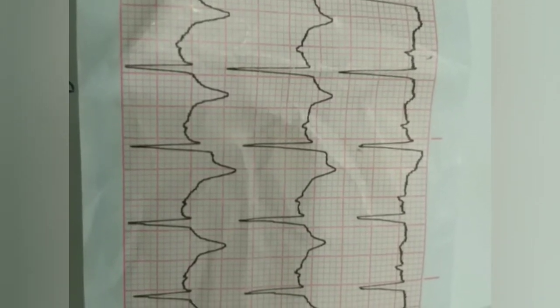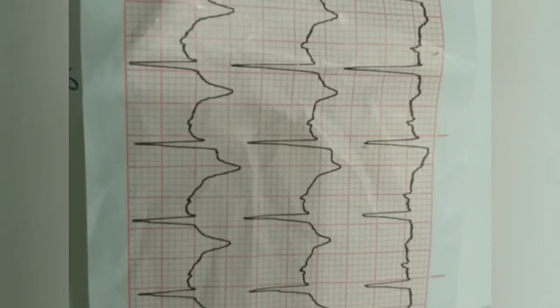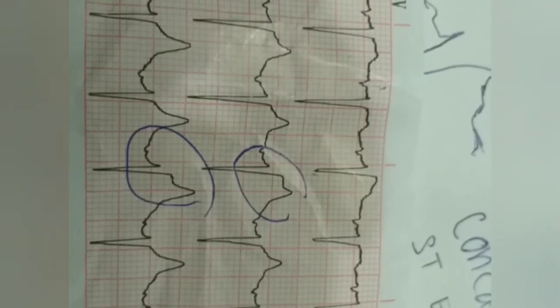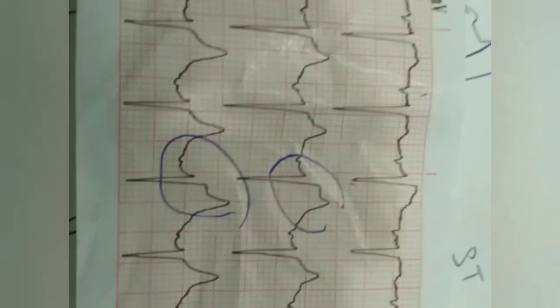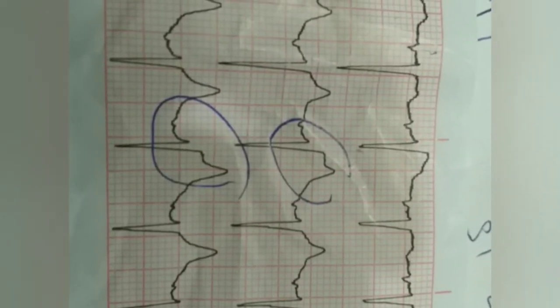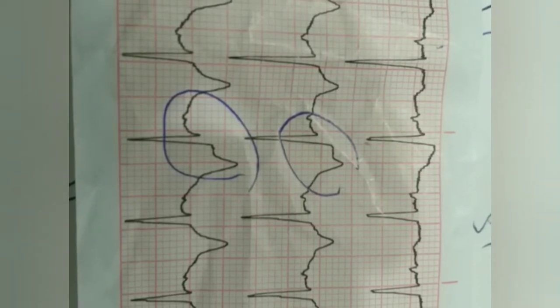So there is indeed some ischemia. Let me make it prominent in lead V1, V2 and V3. Here you see in the circle that there is non-concave or convex ST elevation going higher. J point is going high, and there is a prominent ST elevation in that part of the ECG.